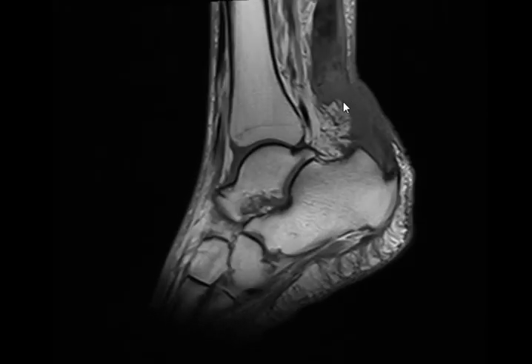But let's say if it were urinary bladder, would it look like this? No. Darker or brighter? Darker. So this has an increased T1 signal intensity. So what gives you high T1 signal intensity? Blood. Yeah. Okay? So there is blood here, indicating complete rupture of the Achilles tendon with hematoma.